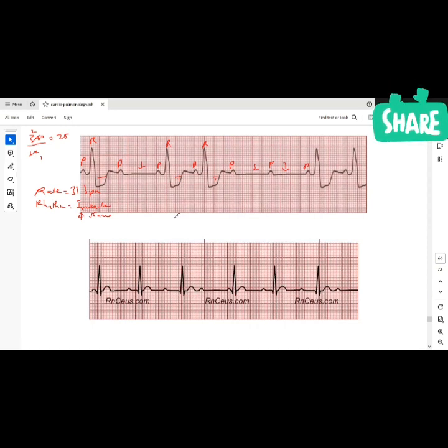There's ventricular depolarization sometimes, and then there's not. So what do you think would explain that? Think about it. Think about what is normal, and then tell me what would go wrong with that normal. What we expect is a normal sinus rhythm.